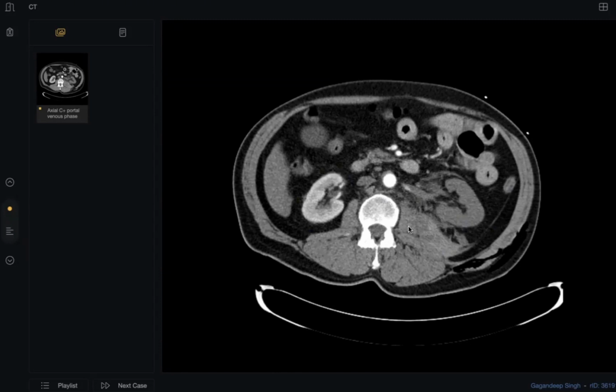There is hypoperfusion of the left kidney, with no relation to the perfusion of the right kidney. No perfusion at all. Why? What happened here? Avulsion, maybe avulsion of the renal pedicle. Excellent. So this is renal vascular pedicle injury or avulsion.